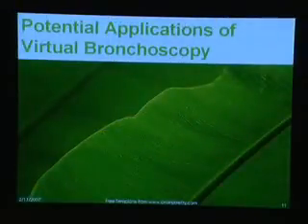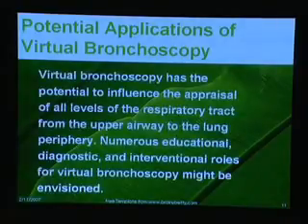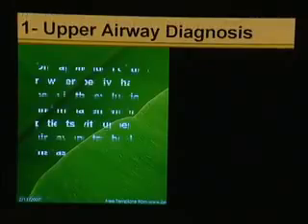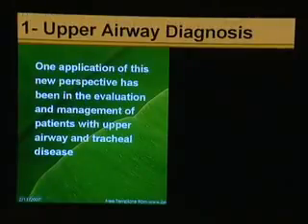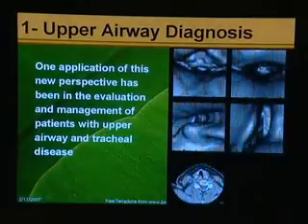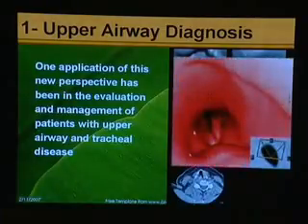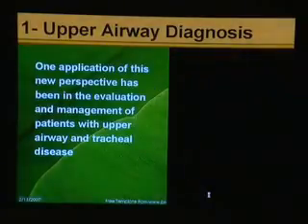We have potential applications for virtual bronchoscopy. We can first start with the upper airway diagnosis. One application of this new perspective has been in the evaluation and management of patients with upper airway or tracheal disease. We have here a polyp posterior to the vocal cords, and this is the level of the vocal cords while approximated together.